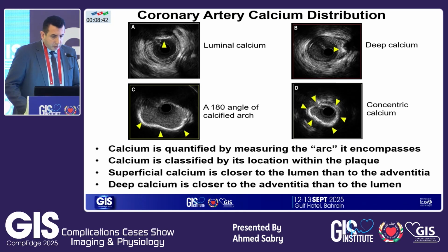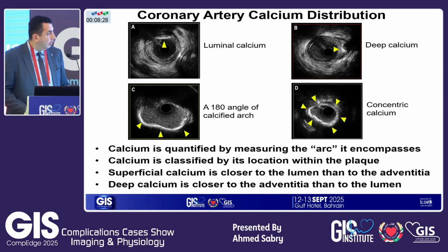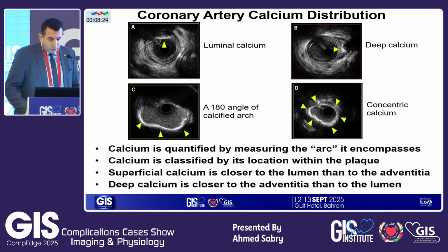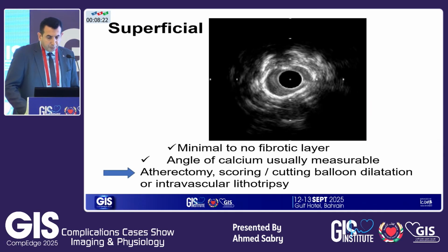Also, we have the distribution of the calcium quantified by the measure of arc, and classified by location within the plaque. Superficial calcium is closer to the lumen than the adventitia. Deep calcium is closer to the adventitia than the lumen.